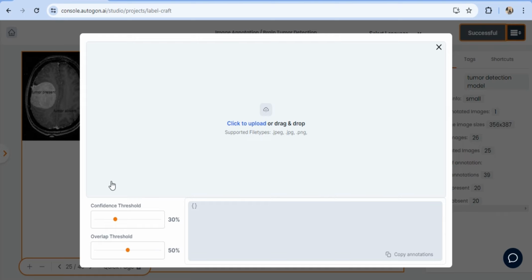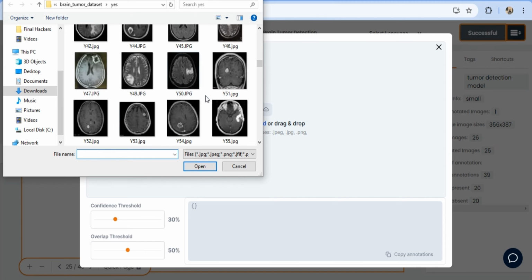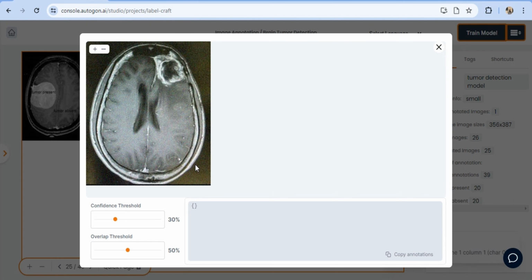So this is run test model. Click on that. That's how you do a prediction with your model. Let's just take one image. I honestly don't expect to get a good prediction because the accuracy is pretty low. Like I said, I'm not shocked. It's not going to give us very interesting predictions. However, all things being equal, if I train this with a proper amount of images, these tags are going to give some very interesting JSON responses, something of that nature.